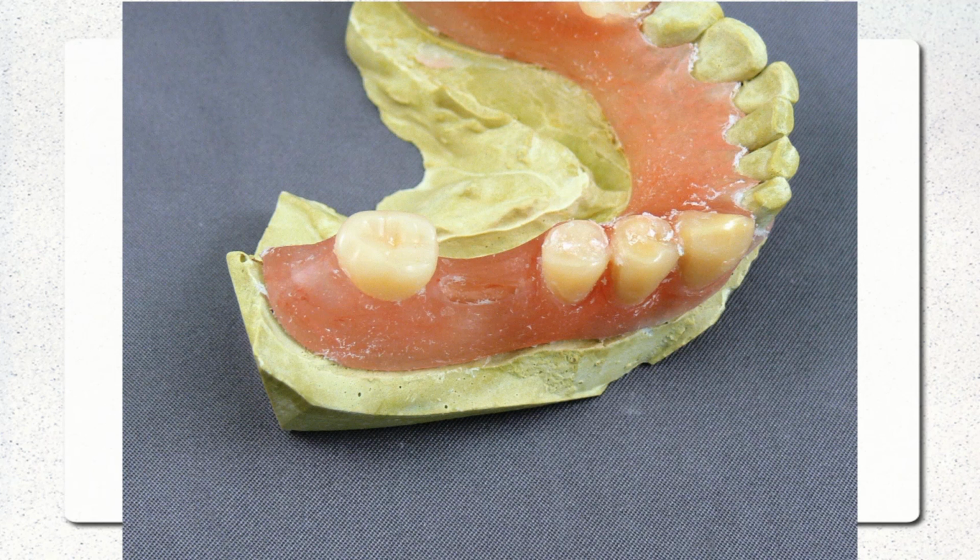And that's very simple. You can add a clasp on, have it done in about half an hour. So what I'm going to do now is show you some examples of how to repair this material. It's going to be with Duraflex, but Duraflex and VisiClear are the same thing. I found that if I show you multiple examples of how to do different repairs, you will in your mind get an idea of how to do a repair when it comes about, because honestly, repairs are never exactly the same.